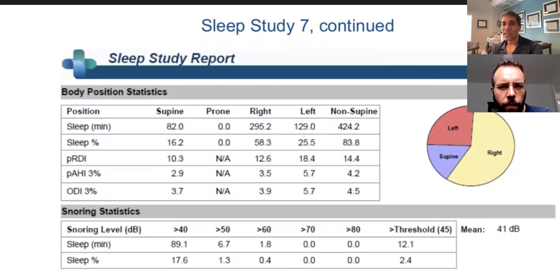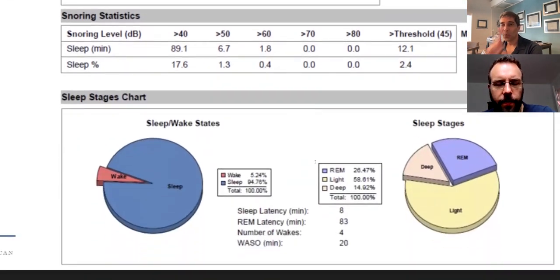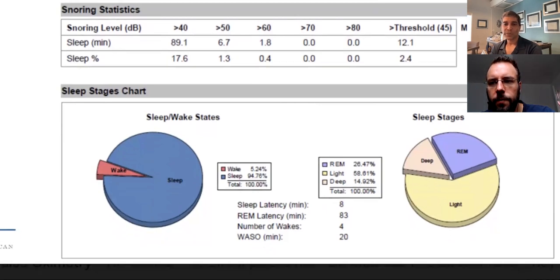The left side was worse than the right side. So they probably breathe well through the left nose. They sleep on the left side and now block their good side. And now the number went up sky high. Does that make sense? Yeah. Okay, good. So we've seen two of them, 2 out of 7, like that. And maybe one bad WatchPAT that was possibly due to PLMs instead, the first one. And then here, the deep sleep was like 15 to 20 is normal, 14.92 is low.